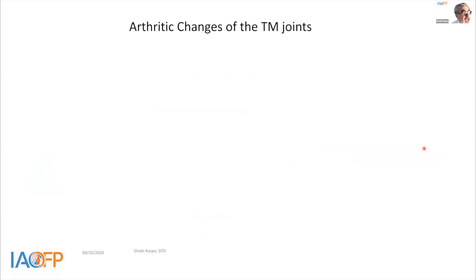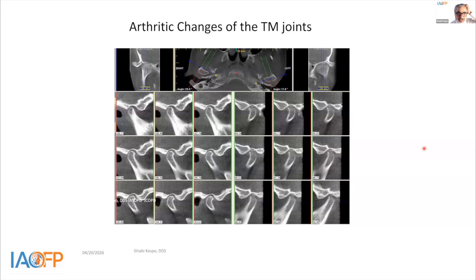In this case, years back, a patient about 30 years old came with limited mouth opening and jaw pain on the left side. I did my CBCT. If we look at the right TM joint, the condyle looks very clean. If you look at the left joint, you see the cortical bone is a little bit off, a little bit deteriorated, a little bit problematic there. I treated her the right way. We treat these patients with anti-inflammatory medication, physical therapy, heating pads, ice, whatever.